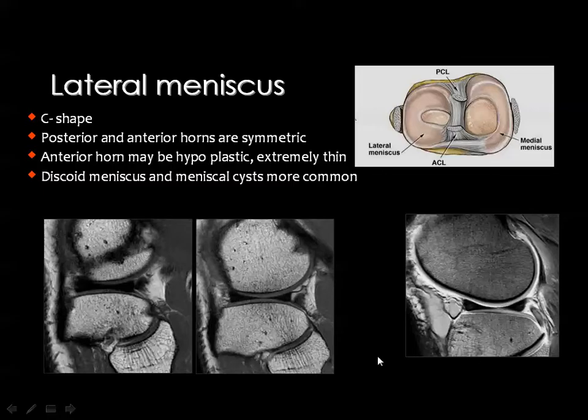In order to know which meniscus you are dealing with, the lateral meniscus is identified by the presence of the fibula and also by the shape of the tibia. And you should see that this appearance of the tibia is made to let the fibula articulate with this particular part of the tibia.